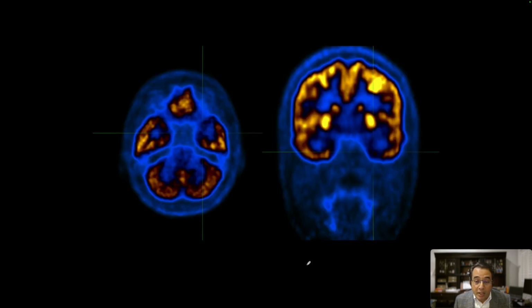This is our last patient. Here we are looking at two images of the brain, axial image and coronal image, and these were acquired using FDG in a patient with complex partial epilepsy, looking at uptake in the temporal lobes, and definitely there is focal decreased uptake in the left temporal lobe, consistent with seizure focus arising from the left temporal lobe in this patient's interictal FDG PET-CT study.